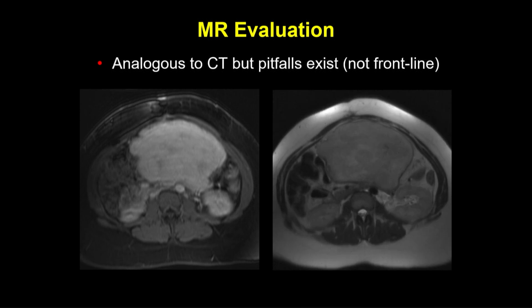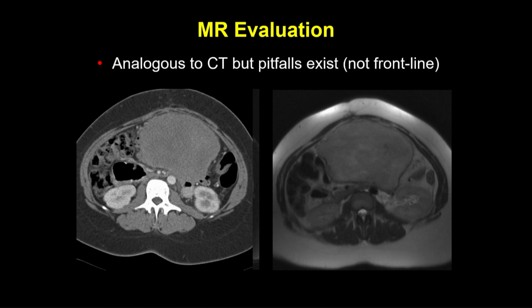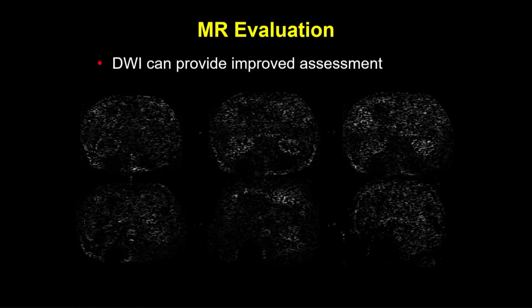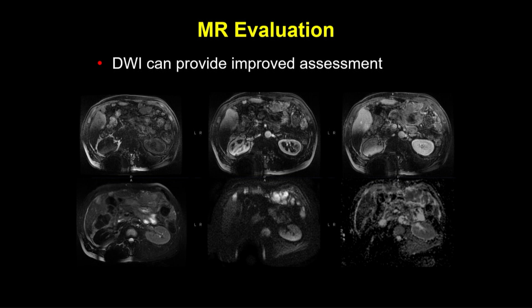Another case of desmoid tumor or fibromatosis, just looking at it on MR, and there's the CT correlate, so very, very similar. Here's a patient with peritoneal sarcoidosis on MR, and it's very nonspecific. It's infiltration of the omentum. This is a very uncommon manifestation of sarcoidosis, as I mentioned, but I'm going to show you lots of different manifestations of some common, but a lot of uncommon things.